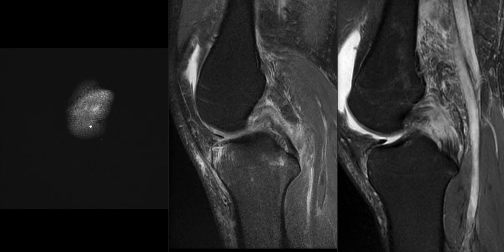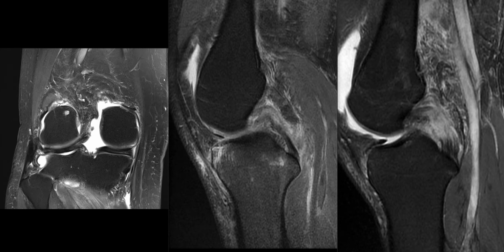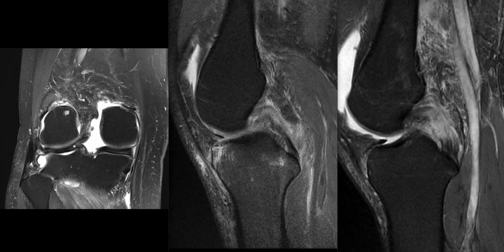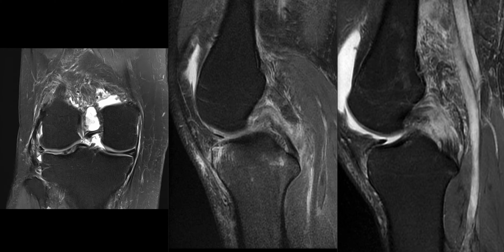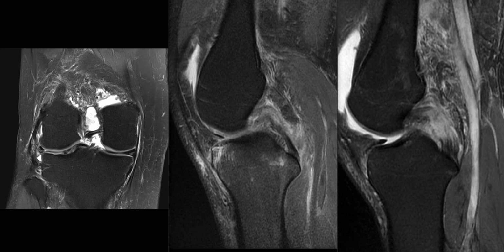And if we look at the coronal image in this patient, we can see that the ligament has been avulsed from the tibial attachment. It is displaced proximally, and in this case is restrained by the meniscofemoral ligament. So this is the meniscofemoral ligament here, running from close to the posterior root of the lateral meniscus up towards the femoral condyle. There are often two components, one anterior and one posterior to the posterior cruciate ligament. And in this case, the meniscofemoral ligament stays fairly taut and appears to constrain the proximal migration of the torn PCL.